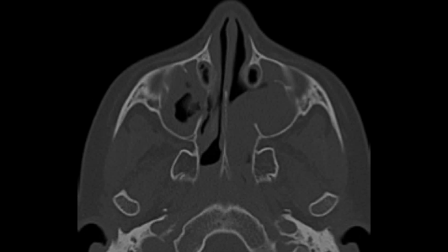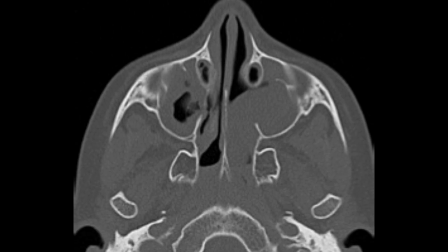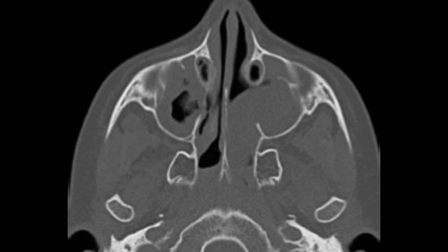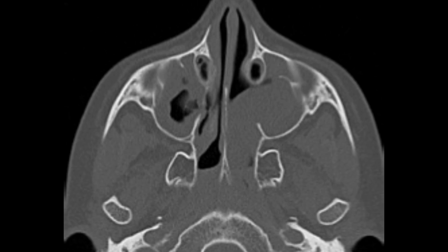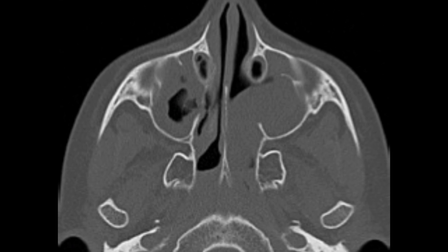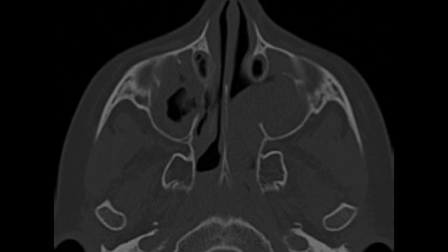An antrochoanal polyp is defined as a solitary sinonasal polyp arising from a maxillary sinus and extending into the nasal cavity through the natural maxillary ostium or an accessory ostium. In some cases, it may reach the nasopharynx. This entity is also known as Killian's polyp. Other solitary polyps are named according to their site of origin and termination, such as sphenochoanal, nasochoanal, frontochoanal, and ethmochoanal polyps. However, the antrochoanal polyp remains the most frequently encountered among these variants.